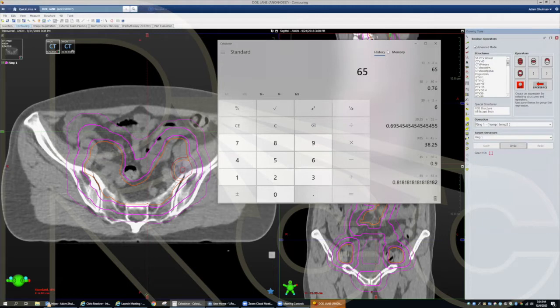At some point, that 5% per millimeter doesn't hold. It can go closer to 3% per millimeter as you get a little bit further away. And if you look at 3% per millimeter, that's closer to, you know, what I think is achievable. So I'll limit this dose to about 65%, 60 to 65%.